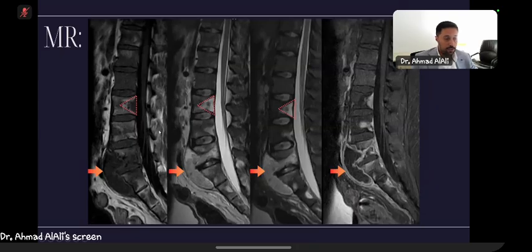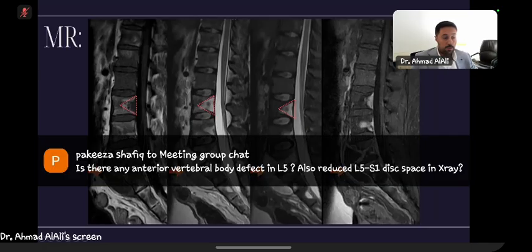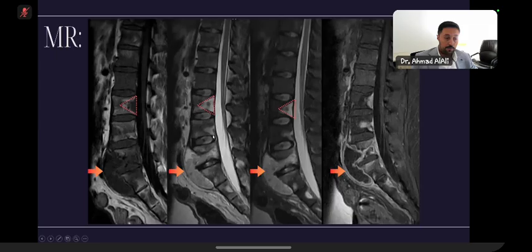Also, this triangular region shows hypointense signal on T1 and hyperintense signal on T2 and STIR with some enhancement as well. However, this is not part of the infectious process. This is part of edema in the bones. If you look at these areas, you can probably see similar findings in different bones, like in this area, and here and there. So just the way that you could see, there is multifocal marrow edema. So this is subligamentous extension.